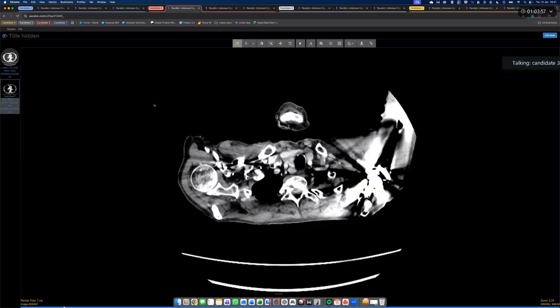As well as additionally, I was also able to visualize a heterogeneous lesion in the region of the porta hepatis, at the hepatic duct confluence, with intrahepatic biliary radical dilatation. So this needs to be further discussed in the oncology MDT.